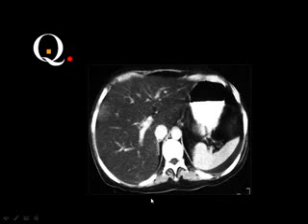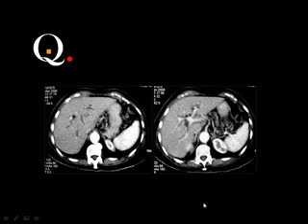A storage disease? Or, you know that in a storage disease, the liver is more dense than the spleen. Okay? But here the liver is more black than the spleen. Sorry? Yes, this is fatty liver, and you see this is the liver which is blacker than the spleen. Then you know that the liver is infiltrated by fat. Okay, and this is fatty liver. Then what's your opinion?